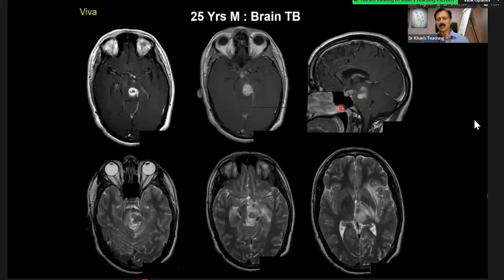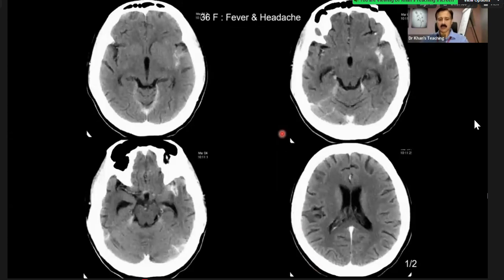But with that, there can be enhancing lesions within the brain parenchyma. And they can be nodular enhancement. And once there is necrosis inside, there will be what we call ring enhancement. All of these things can go on. Please remember in the exam, many a time cases have come in which something is in the spine and something is in the brain, and the unifying diagnosis is that it is TB. So I'm just showing you a few examples of similar cases.